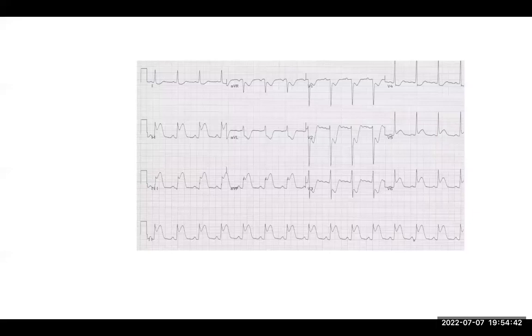Now, this is a very important ECG, and I would like to draw your attention to two things. Number one, there is ST segment elevation in inferior leads. It's very clear. Lead 2, lead 3, and lead AVF. And our rhythm strip is here, which is lead 2 usually. There's a clear ST segment elevation. But there's something else. Because ST segment elevation in inferior leads will cause reciprocal change in AVL, I am also seeing ST depression in lead 1 and AVL.